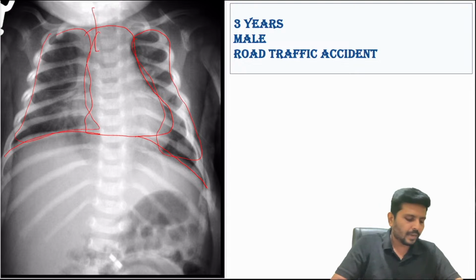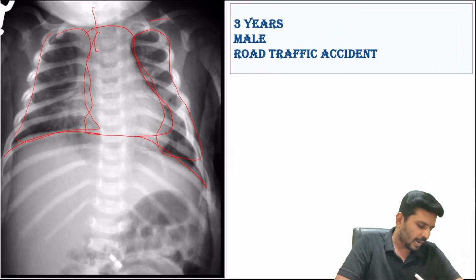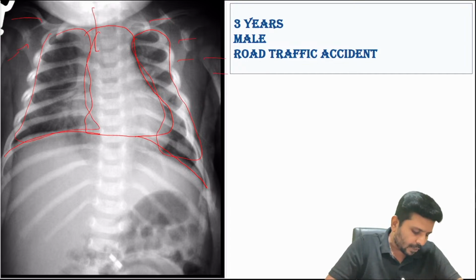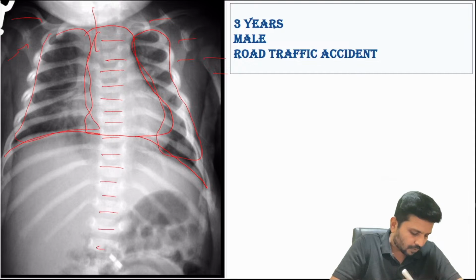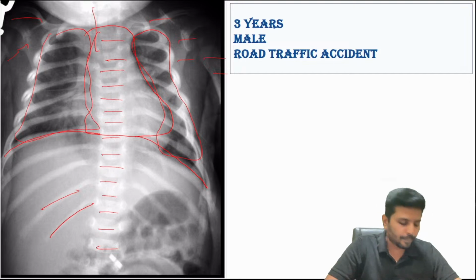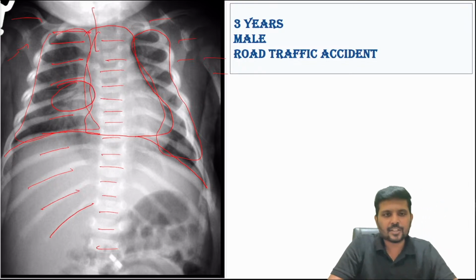But apart from that, it was told to my kids to look into the soft tissue and bones. So clavicle and humerus, scapula, read all, and look at the vertebra from above, either downwards or upwards. So vertebra is normal. Look at the ribs, 1, 2. So let's go from below upwards. Normal, normal. But what is this? Look at this. There are fractures. Look at this. There is a fracture in the rib.